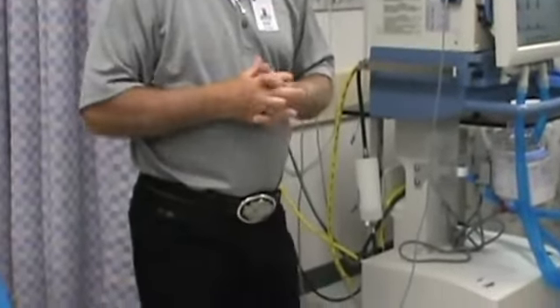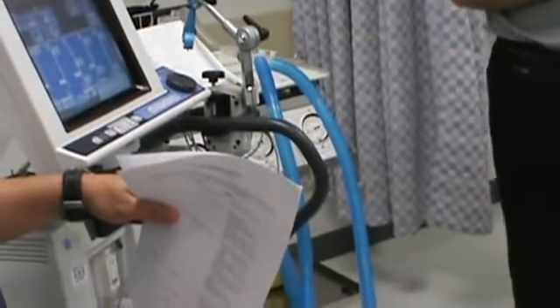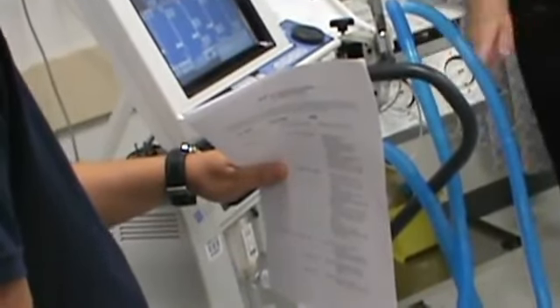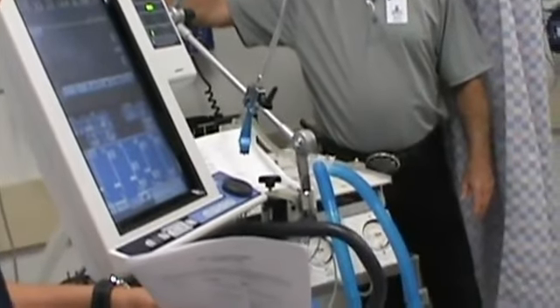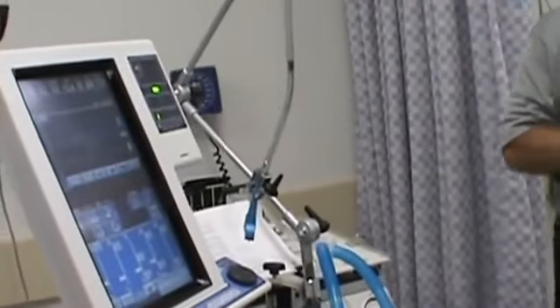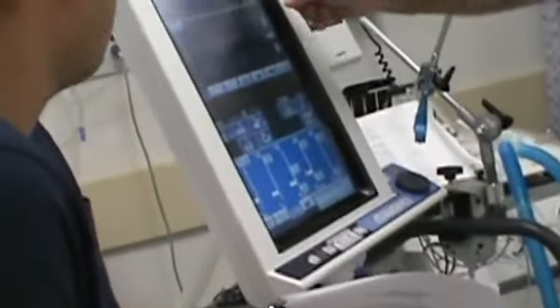Now on the 840, they don't have it. Nebulization for aerosol meds on this vent is through an external source. Meaning I put a T in here, I put in the nebulizer, and then I run the O2 tubing back here to a flow meter. Have y'all done that? What happens the moment you turn that nebulizer on? Yeah, all your alarms start going off. That volume right there jumps, that will jump, that will jump.